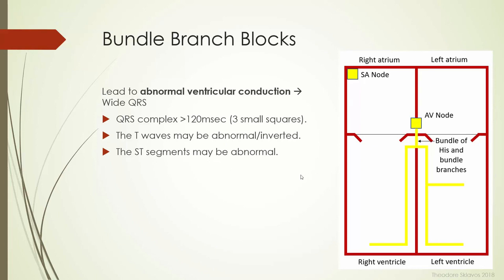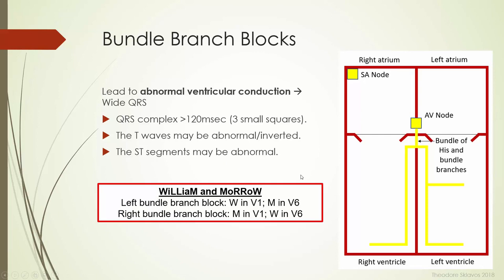Now, the trick to remembering left versus right bundle branch blocks: a lot of people use William and Morrow.